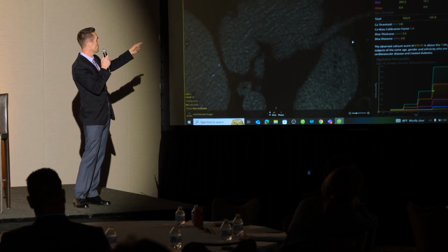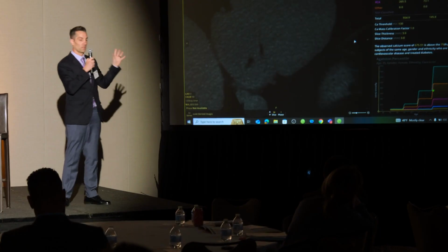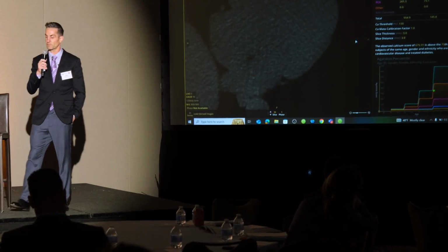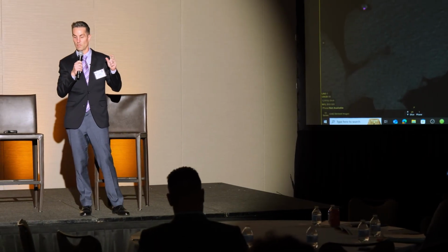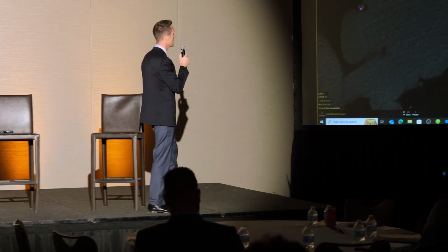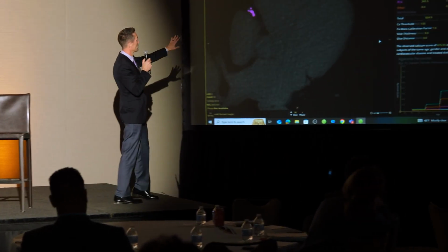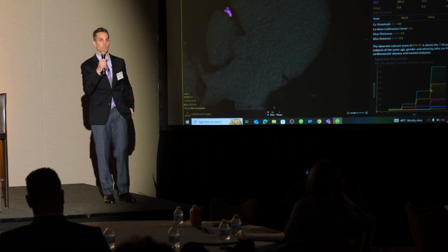And this is where sometimes people ask me about this. If you go back up, Patrick, you can see calcium, all of these densities are put into voxels. So there's some brightness that you may see here, but it remains below the quantitative algorithm with which the calcium score is being done.